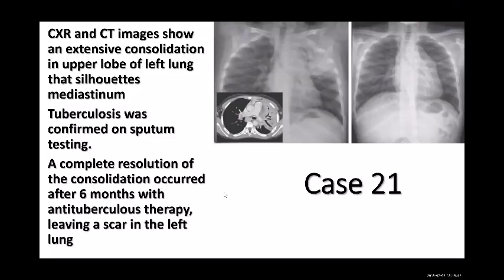And where is the scar in the left lung, doctor? Where is the scar exactly? I don't see that. One minute, let me just see, people are attending. You don't see the scar? You don't see this area? Yeah, I see. That's the meaning of scar? Yeah, mostly the scar, when you have collapse, you see a collapse and increased density in an area. So it's in here.